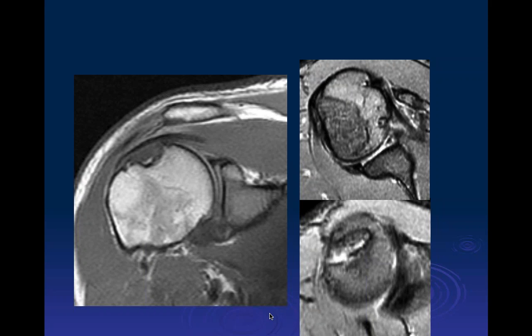Max, what do you think of this? Right, we have coronal and axial images of the shoulder demonstrating Hill-Sachs deformity. Looks chronic. There's no edema there. Yeah, I wouldn't call this Hill-Sachs. Or if you did, you'd have to say it's a superior Hill-Sachs. The normal Hill-Sachs is posterior to this. See, this is right under the supraspinatus tendon, and the mechanism of injury of this is different from a typical anterior dislocation.